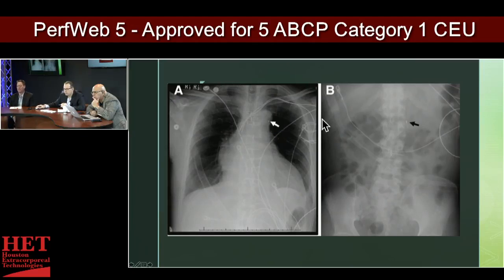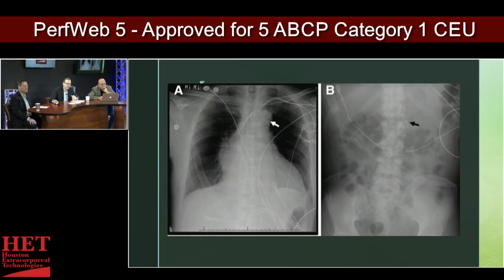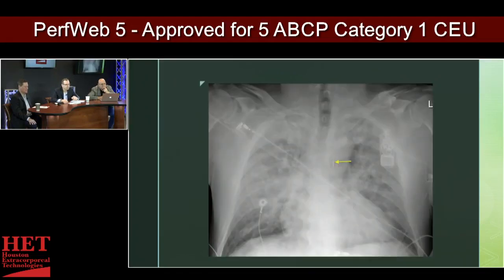All right. But this would be a perfect example of a tip that is extremely low. So this is probably somebody who's not used to putting balloon pumps in, and was scared. And so this balloon pump may actually be inflating and deflating well into the iliacs. Wow. So that would be quite a red flag. So if you get your x-ray and you don't see the balloon pump lead or the tip of the balloon pump in there and you know you just placed a balloon pump, get a KUB. Another example of a balloon pump that looks to be appropriately placed.